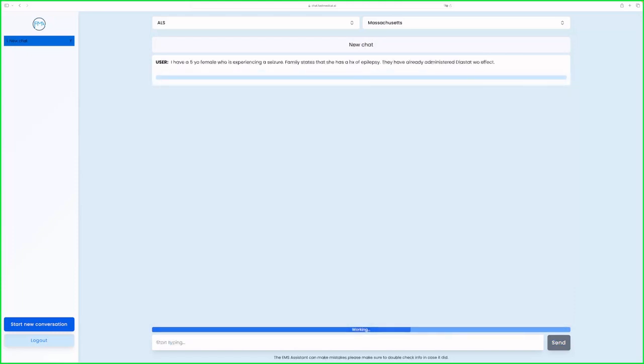You can type into this thing if you want. I think most people are going to be using this on their mobile phone. If we're just testing it, then testing it on a web browser is perfectly fine. Or if you just want a general medical knowledge answer to a question or something. But out in the field, most people will be using this on their phone.